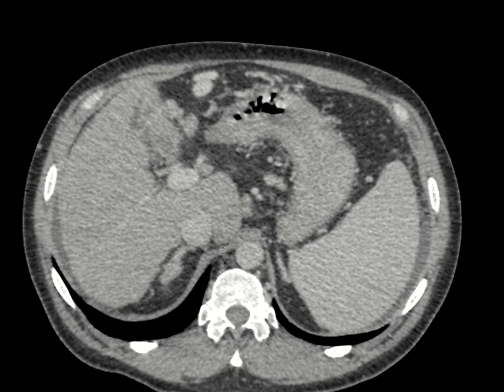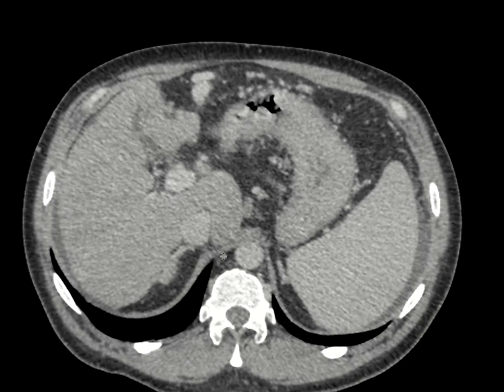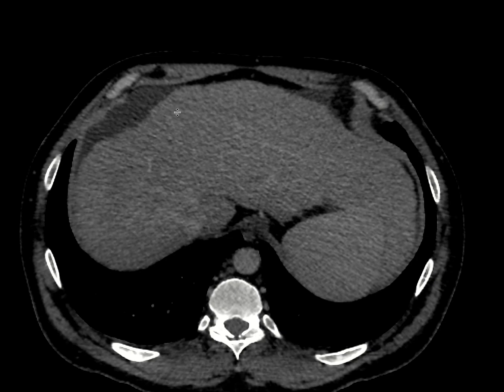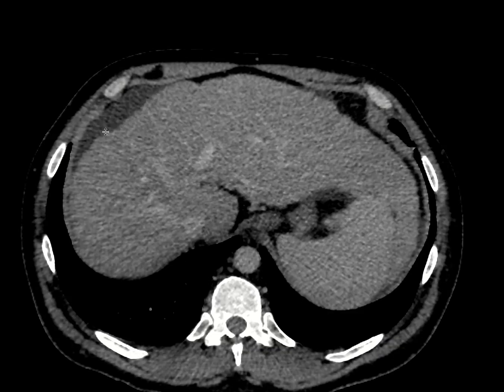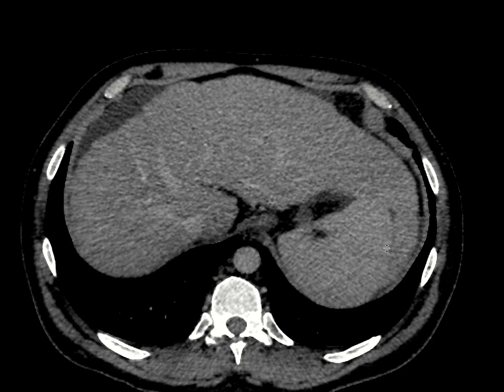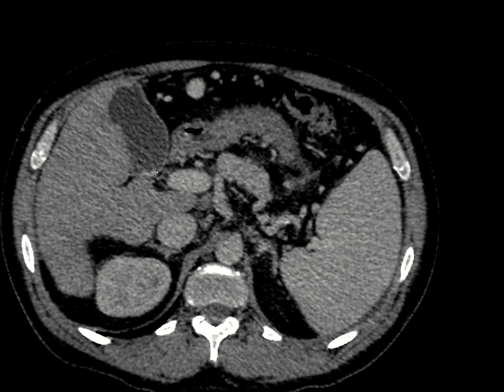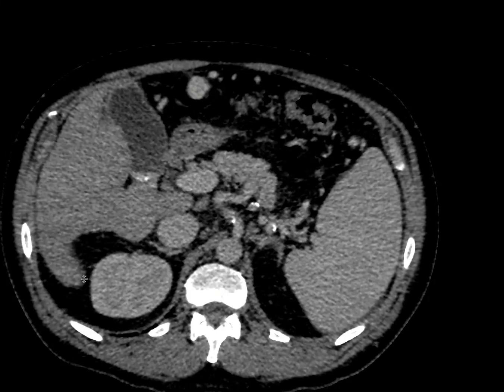Here's a CT scan that was performed in a patient with history of alcohol use, and you can see that the liver here has a nodular surface contour. In addition, there's hypertrophy of the left hepatic lobe. You can see it swinging around and touching the edge of the spleen over here. And there's atrophy of the right hepatic lobe with some areas of scarring.